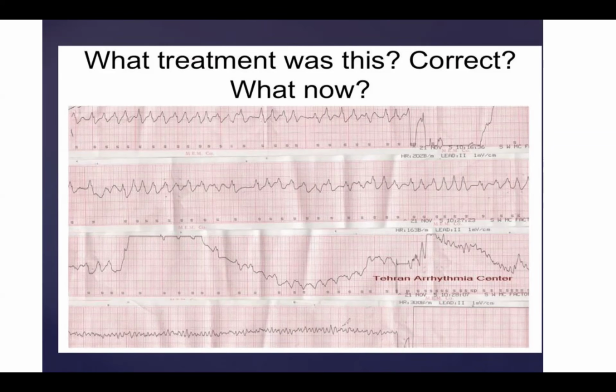So how would you explain that a shock turned this patient who was in this rapidly conducted AFib into VF? If they shocked on a T wave. Right. So basically, it means that they were not properly sensing. And we can actually see the sensing here, but you can tell that it's missing some.